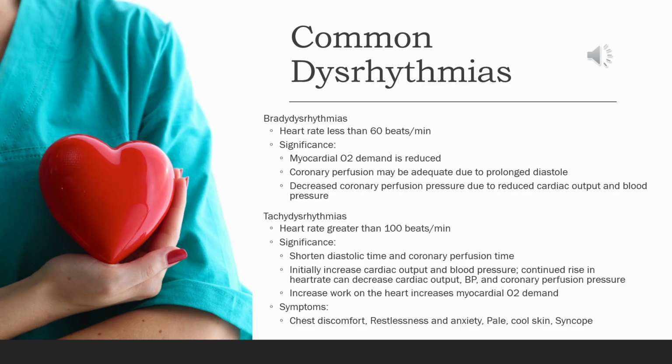So this is any rhythm where the heart rate is less than 60 beats per minute. While a slow heart rate can sometimes be beneficial, it can reduce the myocardial oxygen demand, and it can potentially allow for more adequate coronary perfusion. It can also be very problematic. If the heart rate becomes too slow, then coronary perfusion pressure can decrease, which leads to insufficient cardiac output and a low blood pressure. So this can cause myocardial ischemia, dysrhythmias, hypotension, and even heart failure. So the key takeaway here is that not all bradycardia is harmful, but whenever it causes poor perfusion, then intervention is going to be required.